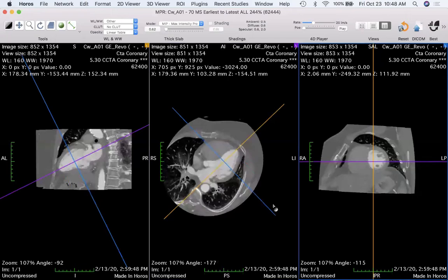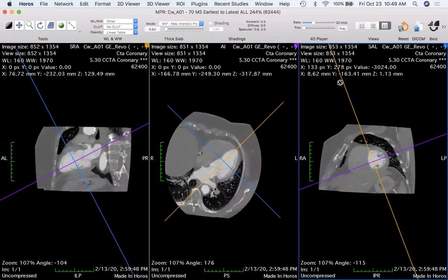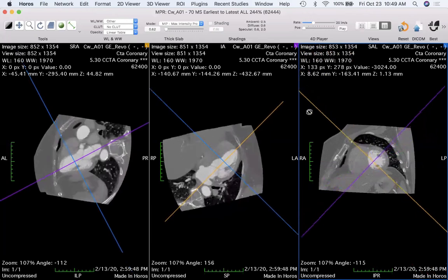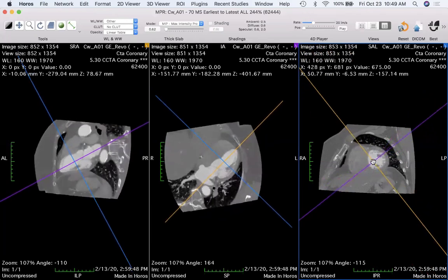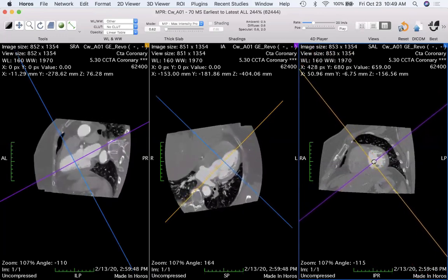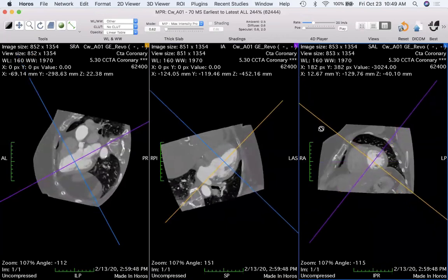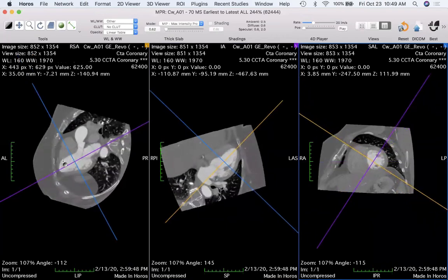These are classic views. The other classic view for looking at the heart would be to take this and rotate it approximately 45 degrees to go to the place that I haven't seen yet. And the rotation, I usually adjust the rotation amount such that I can see the aorta and I can maybe move the center a bit. Well, this is a weird geometry actually. So here, move this down. So there's the aorta. So this is the left ventricular outflow tract here.